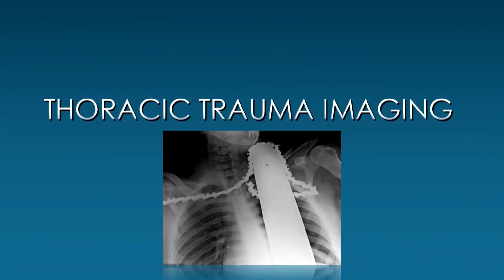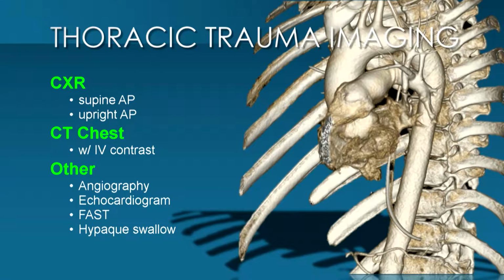All right, so imaging these patients in thoracic trauma, we begin with the chest x-ray. That's obviously our standard. And we give our patients the world's worst radiograph ever created, the portable supine AP chest, which does a very nice job of making the mediastinum difficult to evaluate. In select cases, you can do an upright film in the trauma bay. It's more often that we would do that with someone that maybe has an isolated stab wound somewhere, looking for free air under the diaphragm or something, but it's another possibility.